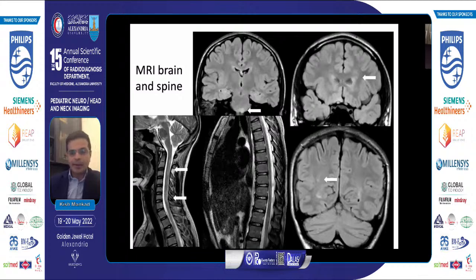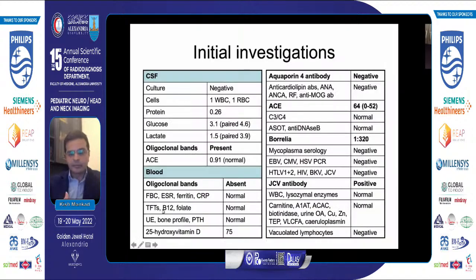You've got brain and spine lesions, but the brain lesions don't look like aquaporin 4 or MOG or MS. The spine lesions are not really NMOSD-like. You've got patchy lesions, multiple levels of involvement. You've got a brainstem lesion out there as well. But if you make it harder, you can call it periventricular out there, subcortical out there. The lesions in the spine look more like multiple sclerosis.